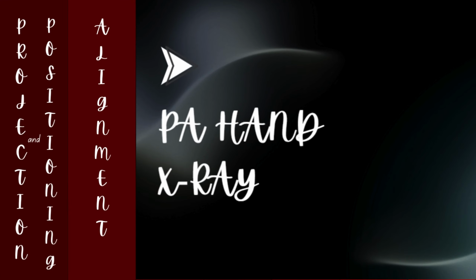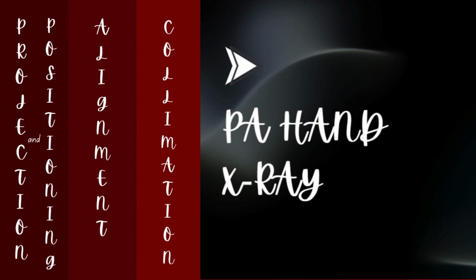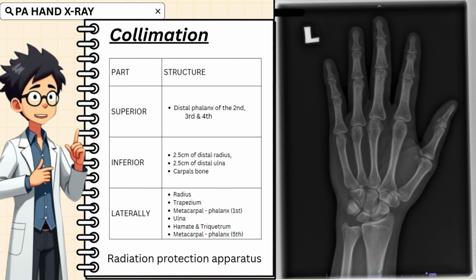Let's move on to the next element of PACEMAN, which is C for collimation. In a PA hand X-ray, collimation should be visible on all four borders of the image receptor and must include all relevant anatomy. This extends from the tips of the distal phalanges at the superior border to the distal ends of the radius and ulna at the inferior border, while also including the soft tissue margins laterally. In this radiograph, there is no evidence of a radiation protection device or lead shielding apparatus visible on the image.